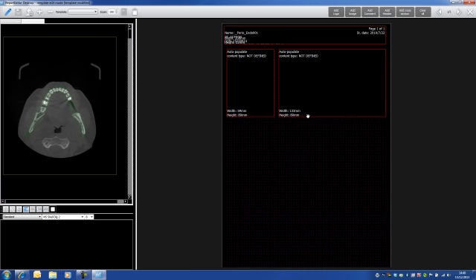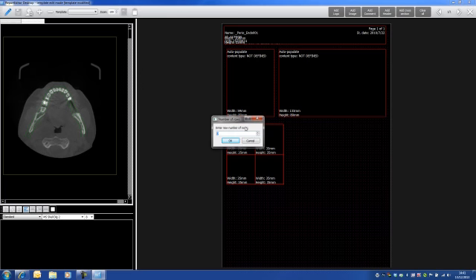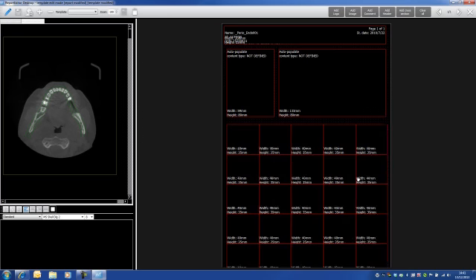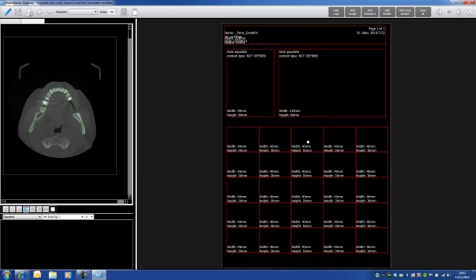And I'm going to add the cross section. Here. I right click on this case. I can increase the rows and the columns. So rows, I'm going to put, let's say 5 rows. And then again right click, columns, 5 columns. There we go. Enlarge them. Perfect. Just diminish a little bit so they fit in the page. There we go.